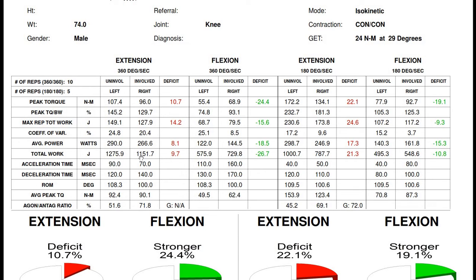There isn't a huge difference. At the end of the day, you're talking 20 millisecond difference there in both. So that to me isn't something that I would be concerned about. That equates to 0.02 of a second, which isn't going to be a speed that we're going to have any conscious control over, so I would say that that's fine. I wouldn't worry about that at all.